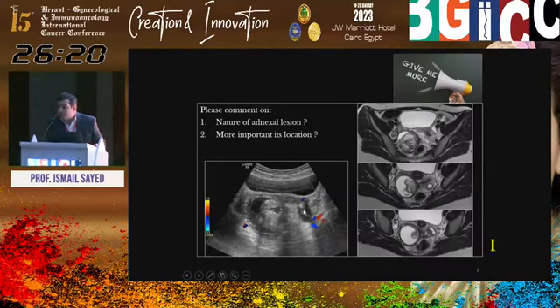And this echogenic structure, echogenic pattern in sonography, maybe fat in dermoid, maybe posterior enhancement, maybe acute hemorrhage. Acute hemorrhage also has an echogenic pattern. So this ovary is in abnormal situs. The guidance here is pain. I know there is an adnexal lesion, mostly dermoid, but pain raises the possibility of ovarian torsion. So please, if you are suspecting torsion and you are not sure, the next modality is urgent MRI, okay?